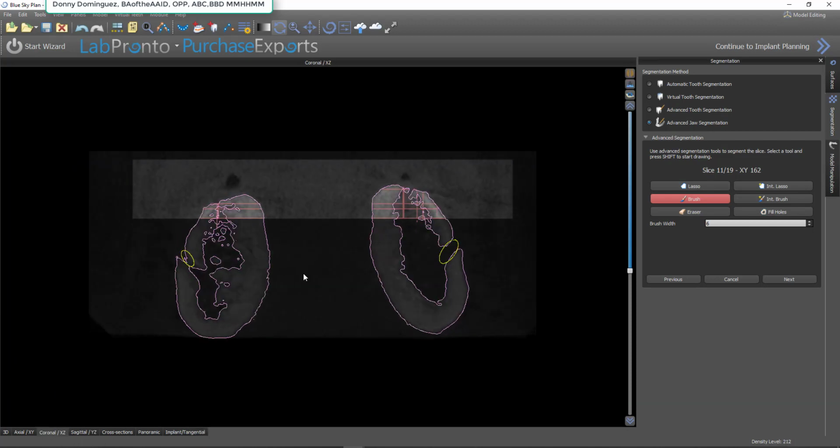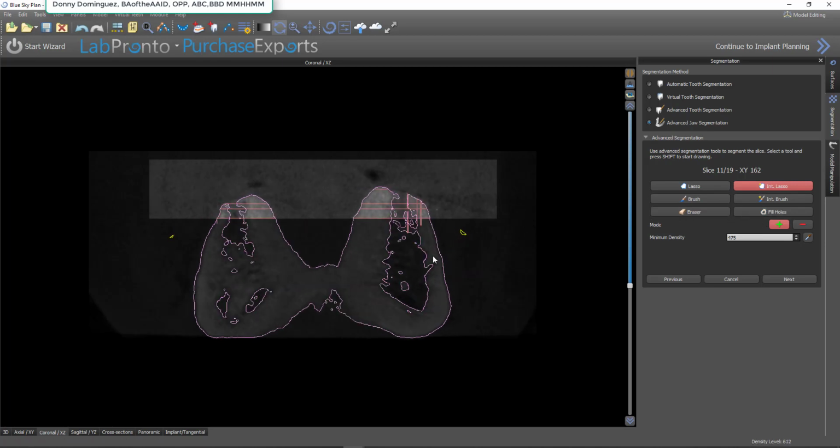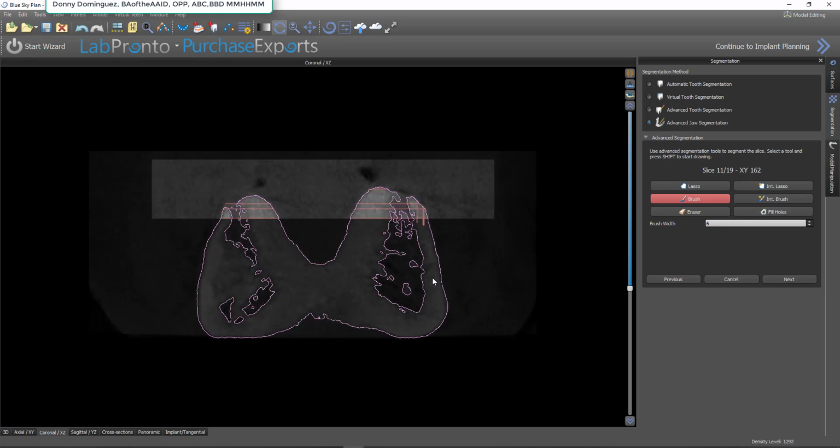Let's go right there. That looks like that may be a good one to do since there's a big hole there. Definitely that slice. So what you're seeing is I'm doing an awful lot more slices here than is being recommended. But I'm taking some educated guesses that help me to really be confident that this is going to give a better segmentation.